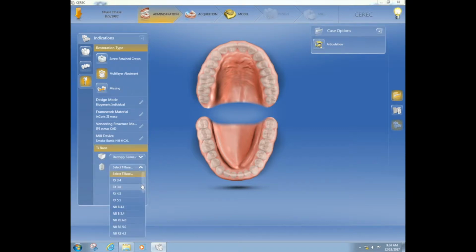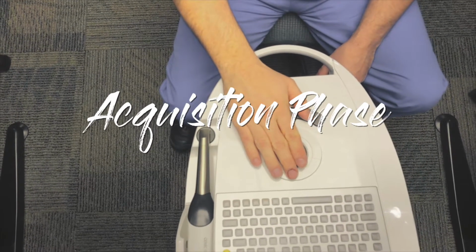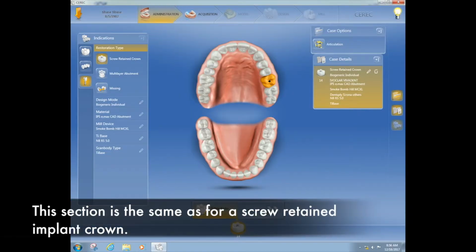Dentsply Sirona Other. Nobel Replace Select 5.0 is the implant that was placed in number 14. Select that. And then we're going to select number 14, and I'm going to show you that it's the same process as doing a screw retained crown. The difference is once we design it. Let's go ahead and acquire.